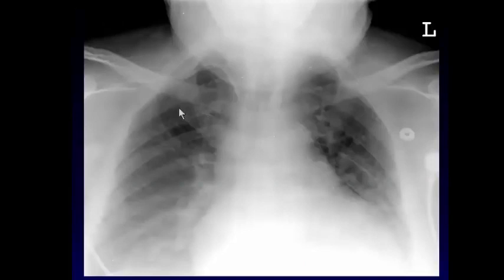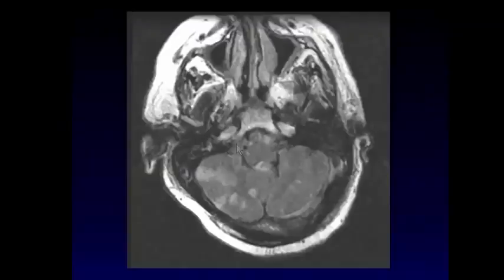This one's a little trickier. This one is sort of behaving in the direction of a venous catheter, but its location is a problem. Remember we said the veins are usually right behind the clavicle, and it goes just medial to the right first rib. Look how high this goes above the clavicle. Look how far this is from the first rib. This is the path of an artery, not a vein. And this is actually the right brachiocephalic artery here. It becomes the subclavian artery here. And if you think of what vessel originates here from the subclavian artery, it's the vertebral artery. And unfortunately, this patient had multiple posterior circulation strokes from that arterial catheter.